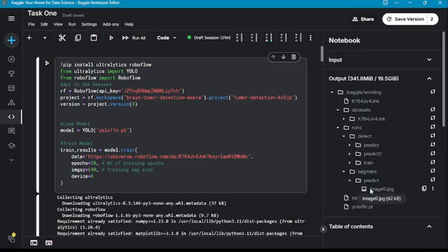so this, let's view the image, because okay, let me say download that and open file.